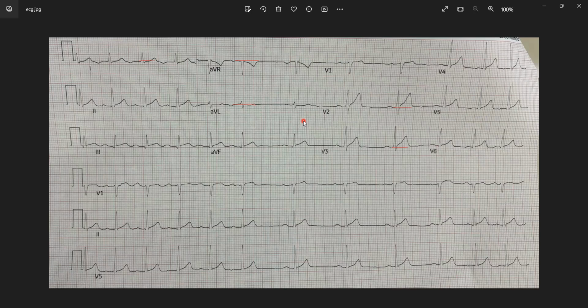I wouldn't thrombolize this patient immediately in the emergency department, simply because we don't have a definitive diagnosis, and you'd want to get a definitive diagnosis before you go ahead and say, okay, I'm thrombolizing. But it's just an interesting case that came through.